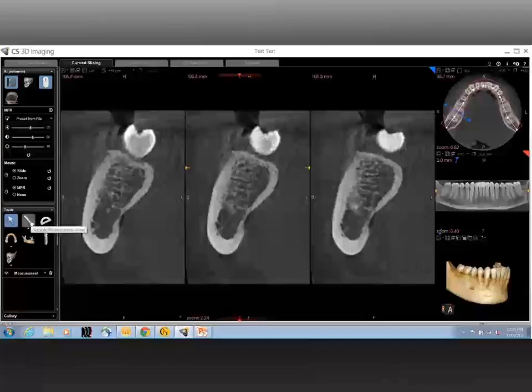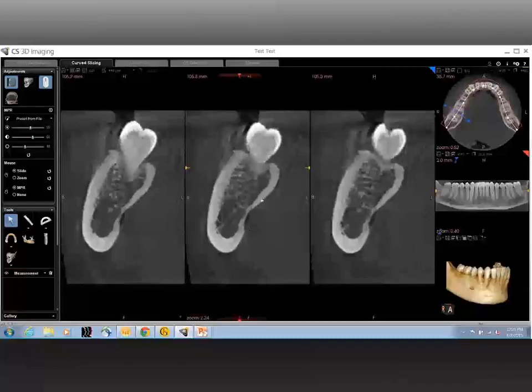Now, beyond that, you also have to look at the lingual undercut. Now, every human being, all of us do have some sort of lingual undercut to some degree. Is it a very critical finding? Probably not. But in terms of implants, it is important to note, as you notice, that there's a slight thinning of the cortical bone there.